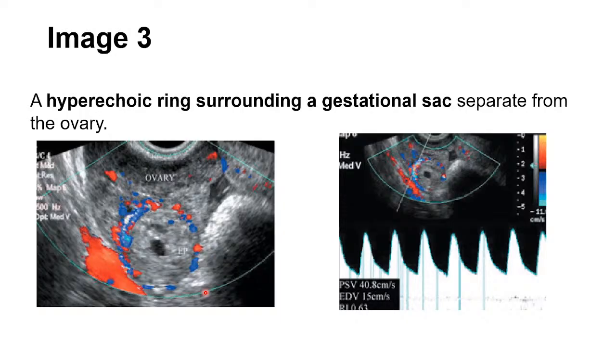Most people miss this. Most sonographers have missed this. Even now, 90% or above can still miss this. What do you think it is? How would you report this? That's where hurried reports get so disturbing. False reports are made. The life of patients is put at risk.